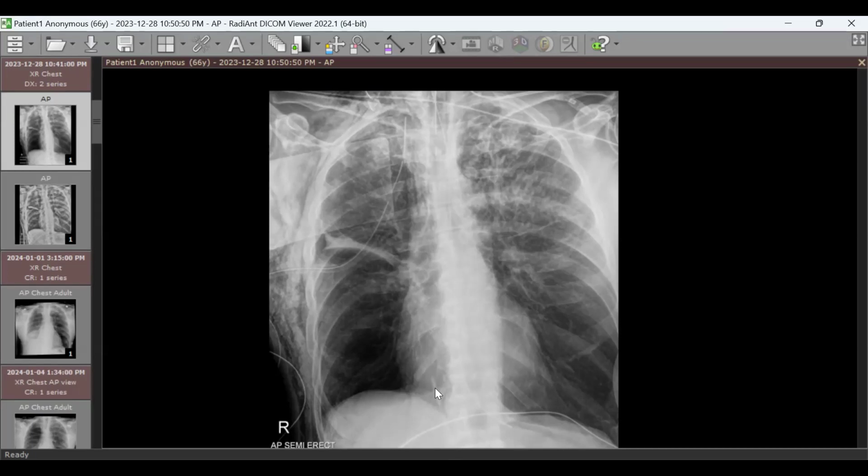This one here? I see it. What's this? I think this is the site of the IVC, could be a filter. Yes, it's a central venous catheter through the IVC. But if the patient had a central venous line through the superior vena cava, what is the normal level? Sir, it's the IVC filter, no, sorry, I mean through the superior vena cava, a central venous catheter superiorly.